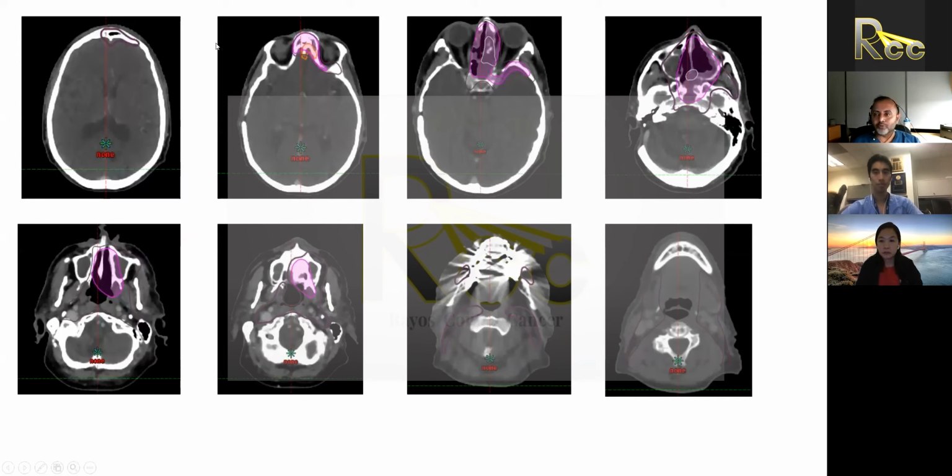And I'm going to walk you through my contours here. Ignore the contour in orange. The contour in orange is the pre-chemotherapy volume, and then he actually had involution of disease. But this is the initial external beam volume. What you can see here is essentially 2 volumes. The purple volume is 54 gray, and the pink volume is 60 gray. And what you see here in green is the gross disease after that second cycle of cis etoposide in this patient. You can see here that I'm treating the frontal sinuses. You can see that I'm covering the dura, given that this patient had intracranial extension into the anterior cranial fossa.